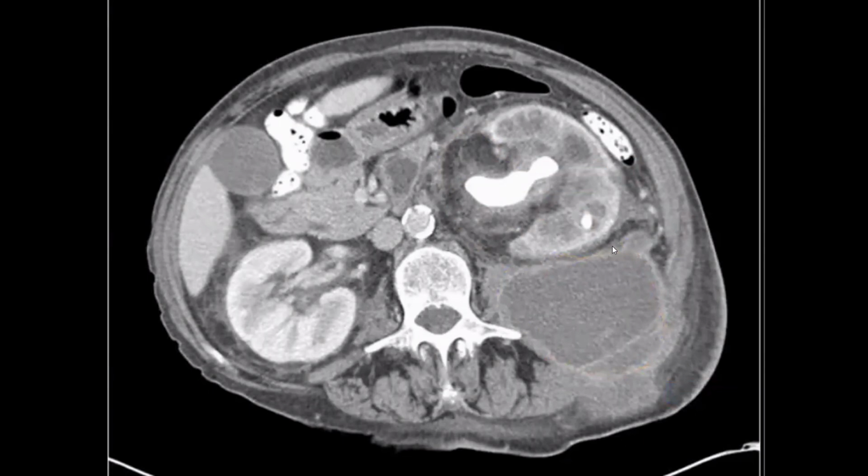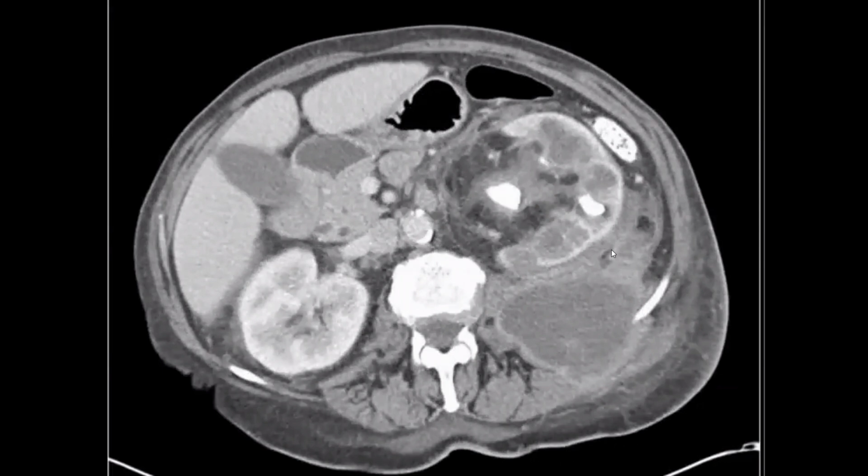So the most logical thinking is that we have Xanthogranulomatous nephritis, which is characterized by lipid-laden macrophages, macrophages rich in lipid content. Do you know what Xantho means? Xantho means yellow color, yellow fat color. So Xanthogranulomatous nephritis is a chronic granulomatous infection with abundant fat content, as you see here in the renal sinus. So this is a case of Xanthogranulomatous nephritis.